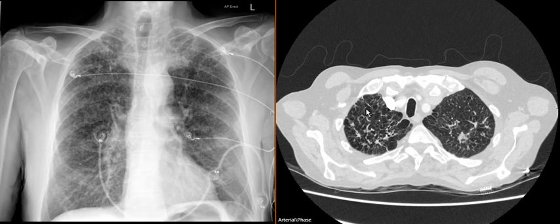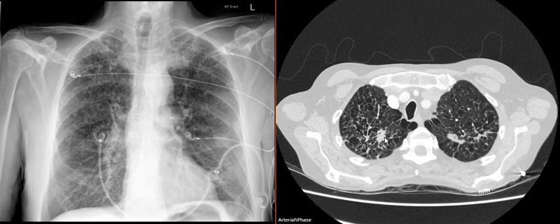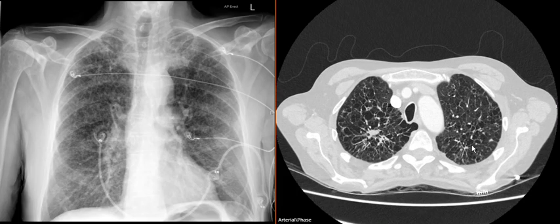So these are holes, and then some of this is okay lung tissue. And then these enhancements, which may or may not be problematic, but certainly something that would excite investigation at some point. So again, what looks like foam is just walls and voids in COPD lung. So lots of holes, lots of bullae everywhere.